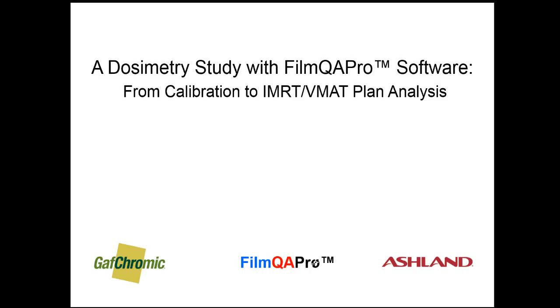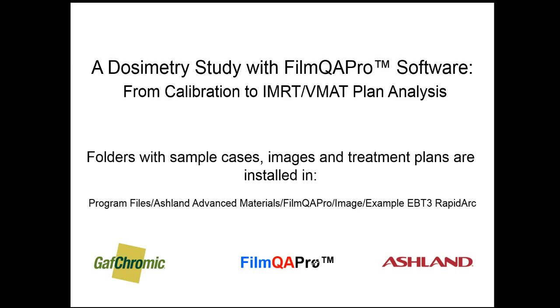This short video tutorial contains abbreviated instructions on how to use the FilmQAPro application to do a measurement-to-plan evaluation of a patient-specific treatment plan. It includes the steps of film calibration and calculation of a dose map from an exposed radiochromic film.